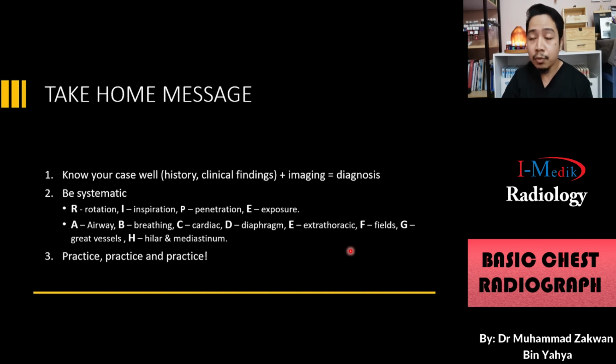When you look at a normal radiograph, don't ignore it, just remember it properly, because when you remember a normal chest radiograph, it will be easier for you to pick up any abnormality in an abnormal radiograph. So make it a habit. Every single radiograph you look at is a learning point. It is a learning process.